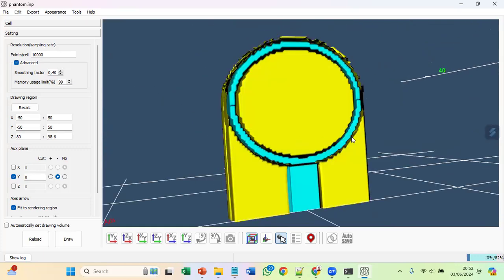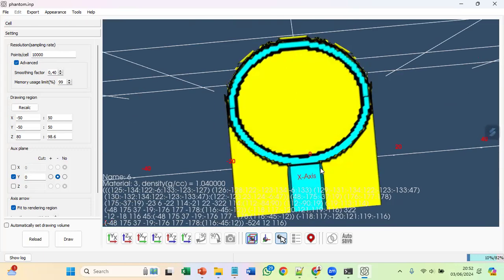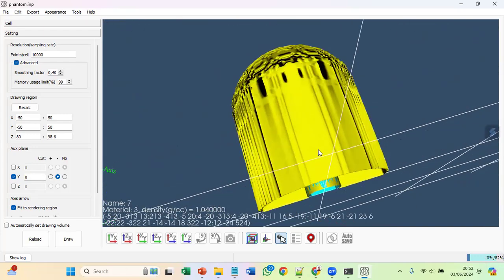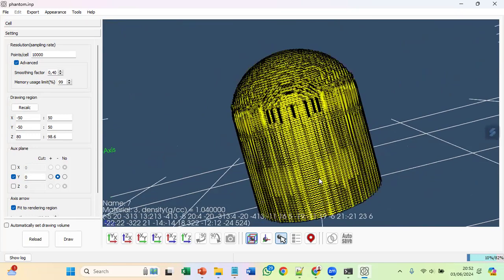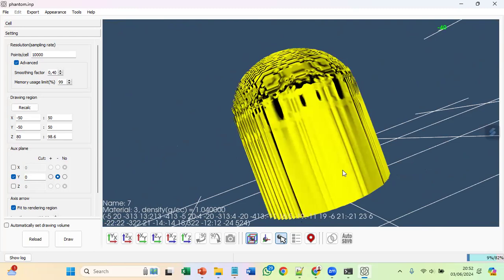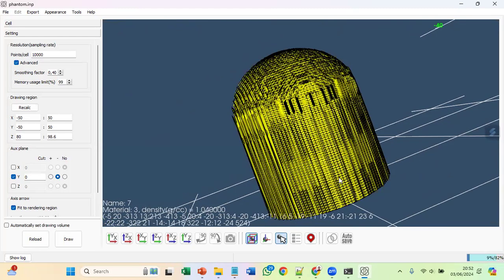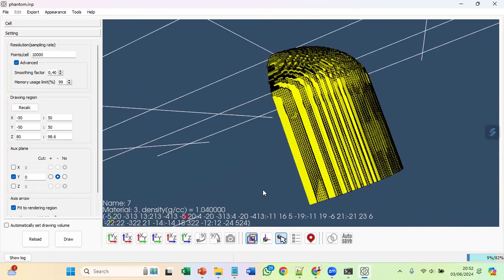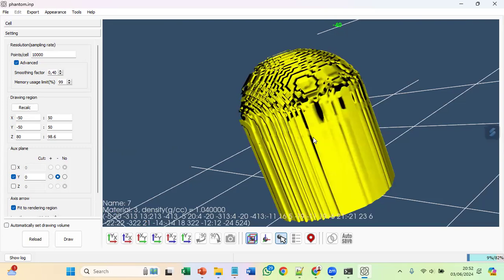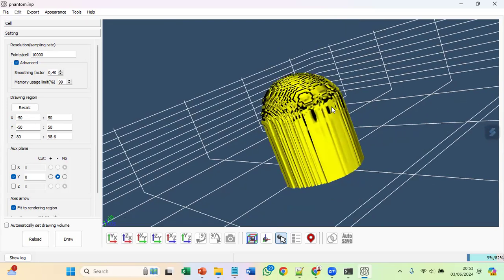So if you want to create such a lip cancer, I think first you have to model the mouth. You can use simple geometry like a ball to model the mouth, or model another organ at risk. For example, if we need eyes, we can just put some balls in this phantom.